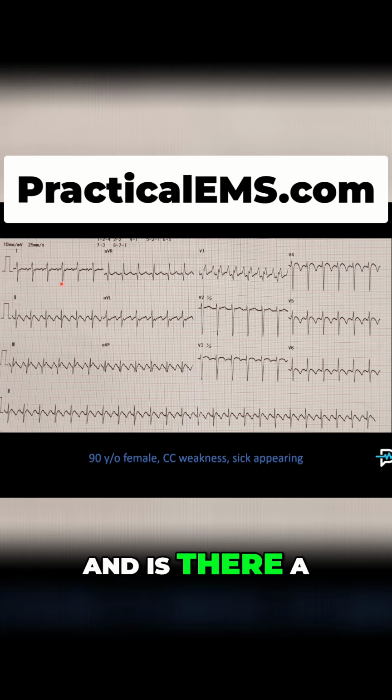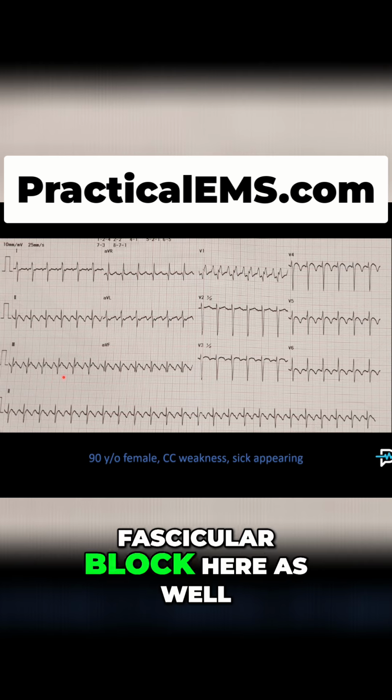And is there an S in lead 1? And there is. And a Q in lead 3? And there is. So I think we do have a posterior fascicular block here as well.